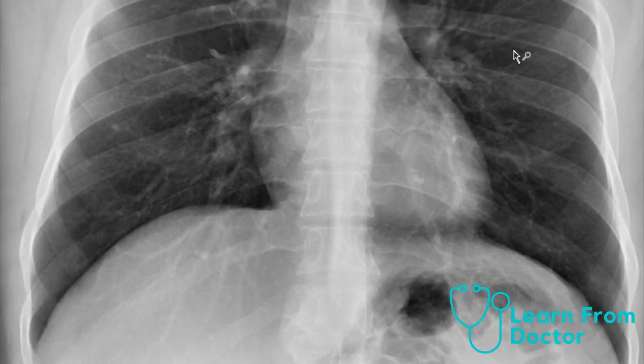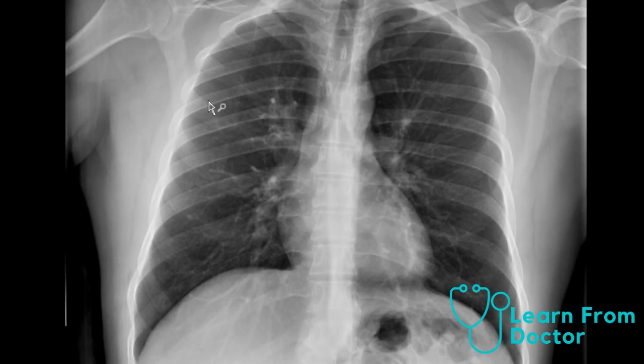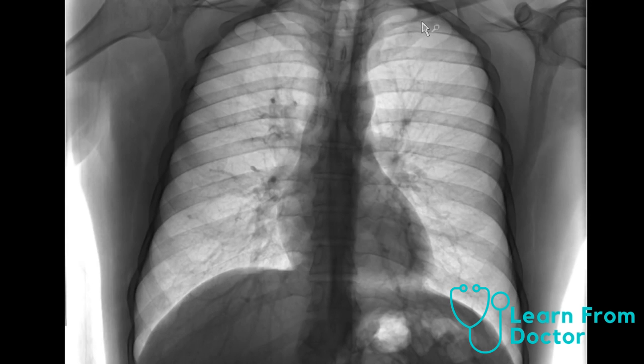So then what I do is I go down to the lung bases, because sometimes you can have a nice linear pleural line down here, which would indicate a basilar component of a pneumothorax, or even a loculated basilar pneumothorax down here. Sometimes if I'm having trouble deciding if there's a pneumothorax or not, I can switch to the inverted windows, which can sometimes give you a nice contrast between the pleura and the adjacent ribs or whatnot.